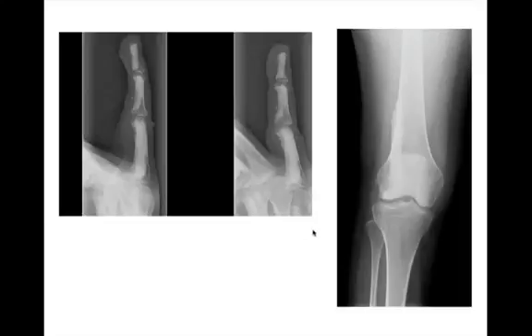Okay, so here we have our classic dripping candle wax on the femur, right, running along here, and there's also this diffuse sclerosis involving the finger. So this was a case of melorheostosis. This is the classic description, the classic dripping candle wax, and this is not as classic of appearance, but this was the same patient. This kind of sclerosis, this dysplasia along the sclerotome. This is melorheostosis.